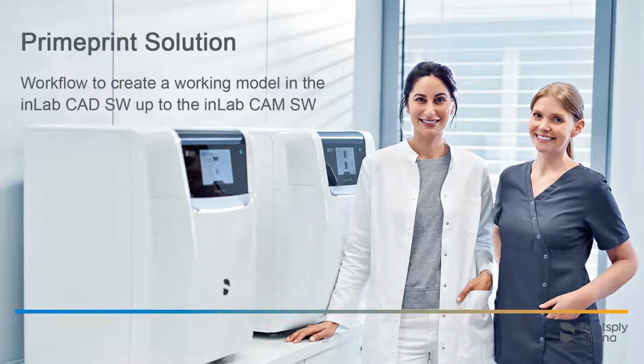Welcome to this video tutorial on the topic of Primeprint Solution. In this video, we will demonstrate the workflow of creating a working model. We will guide you through the InLab CAD software and the InLab Model app to the InLab CAM software.